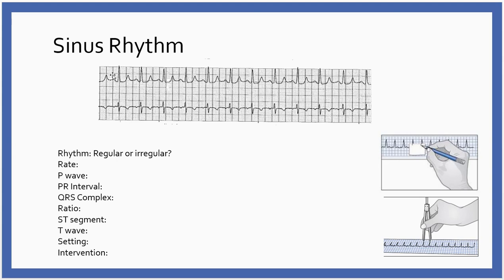T wave. And so my T wave, notice it's a little bit on the pointy side. Not too bad, but it's not really rounded. So although I'm not happy with the shape of my T wave, it is what it is. So I can note that it's a little bit on the peaked side, but I do have T waves, and they're consistent all the way through. Notice on this lead, so here's my upside down P wave. This is my QRS, and it's kind of this biphasic QRS.